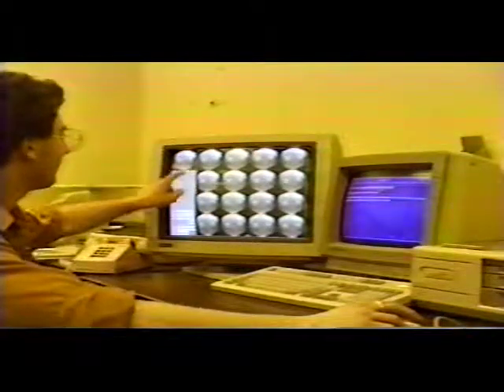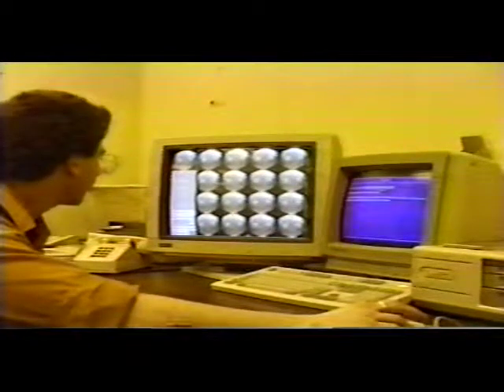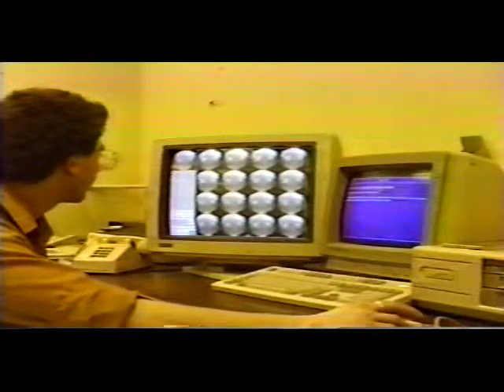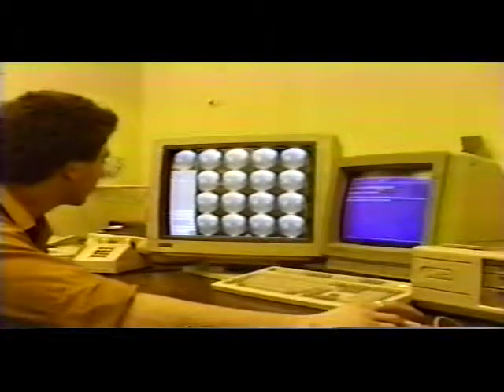We have a picture here, and we can step through fast, which is about 5 frames per second, or faster, which is about 32 frames per second. Or we can go slow, or slower. You can stop it and step forward one at a time.